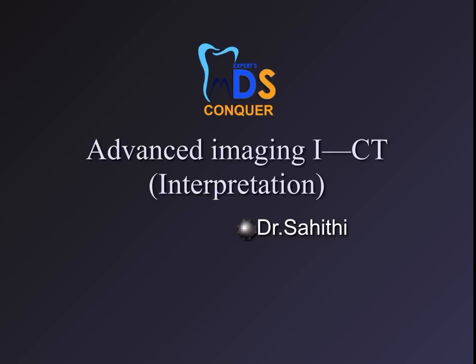So next I am going to discuss advanced imaging part 1, and here I am going to explain how to interpret a CT image. In part 1 I will give you a detailed explanation of how to interpret an image related to computed tomography, that is, the CT image.